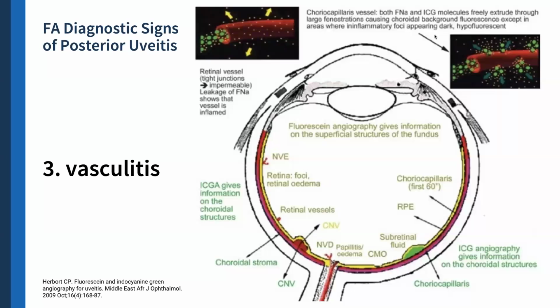The fluorescein cannot just freely escape. So choroidal inflammation would now appear as hypofluorescence on FA. Okay, but again, as we all know, FA is not too good in imaging the choroidal circulation. So ICG pa rin yung better for choroidal inflammation, but that's an interesting tidbit to help you understand the patterns on FA.